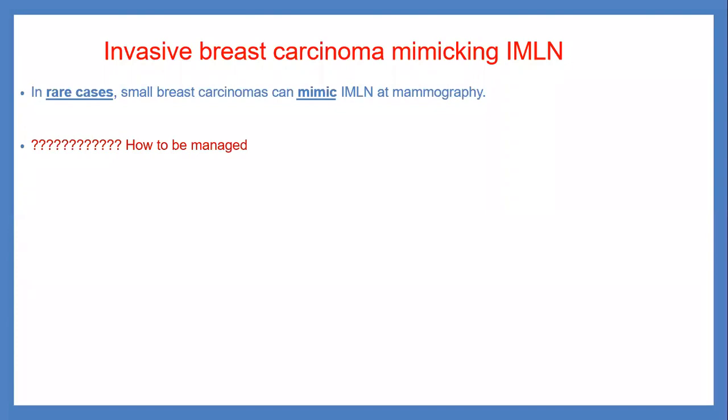So I will search for other associated features in the imaging, other suspicious or alarming features. Okay, as you have seen in that mammo, there was nothing, only the nodule that appeared on interval. Yeah. And at the beginning, it was circumscribed. So it can be an intramammary lymph node.